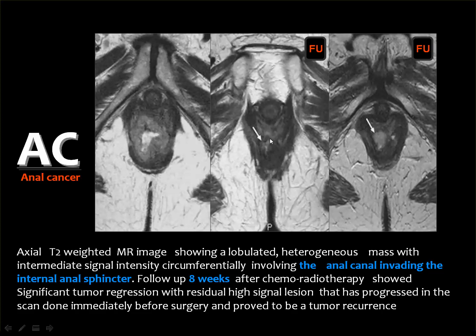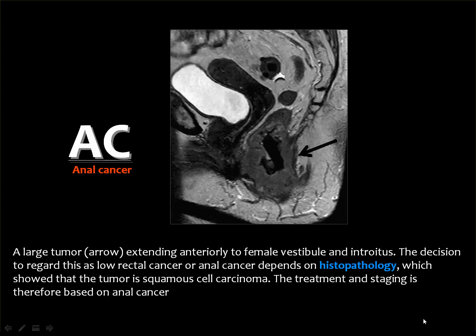Then the follow-up after 8 weeks showed significant improvement on chemoradiotherapy, but at the time of surgery, and you know that these tumors are downstaged by preoperative chemo irradiation, then they are removed to enhance the outcome of surgery. And at the time of surgery, the tumor has grown up, and this was confirmed as local tumor recurrence.